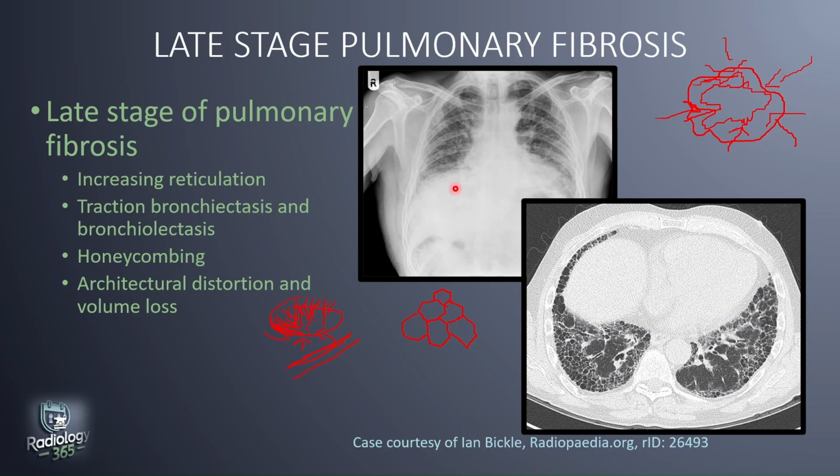So in this x-ray, we see small volume of the lungs bilaterally with bilateral increased interstitial markings, most pronounced peripherally, in the peripheries. So you see here, and there's no clear zonal predominance of this interstitial markings.